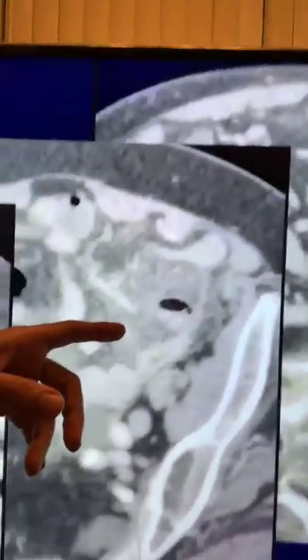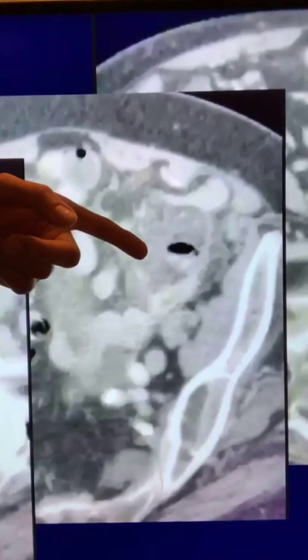I think that's pretty much it for diverticulosis. What else did I show you guys? Oh, yes, let's go to this. I showed you this image right here, I believe. This guy right here. And I said, what's going on right here? I want you guys to now put yourself in the driver's seat. You have a patient coming in complaining of abdominal pain. A lot of these patients, it's just vague, generalized abdominal pain. They can't really pinpoint it. But if they can pinpoint it and they say right lower quadrant, immediately you're starting to think about the appendix.